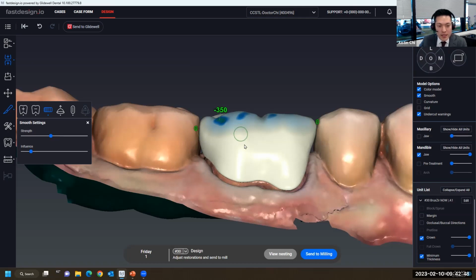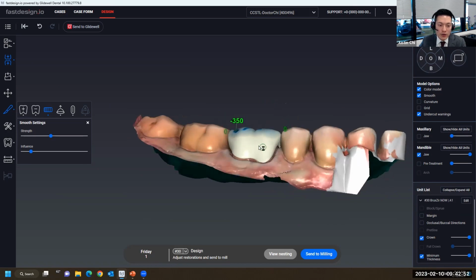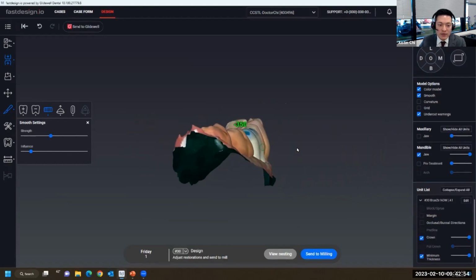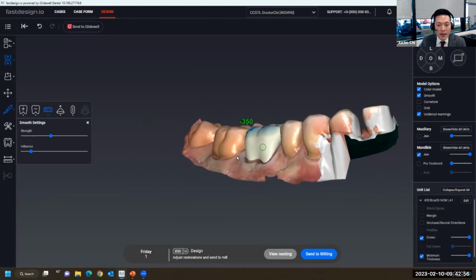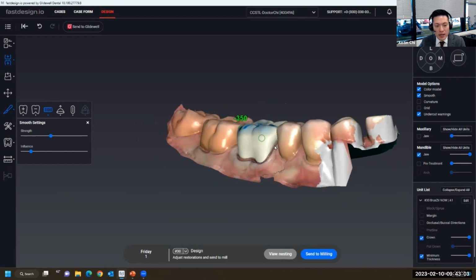All right, aesthetic harmony. I mentioned how wanting to visualize it with the adjacent teeth, and that was also kind of done at the beginning, just seeing, does it flow with the adjacent teeth? And on the next case, I'm going to show you a little bit more, since it is a premolar, how important that is. So we set the occlusal contacts.